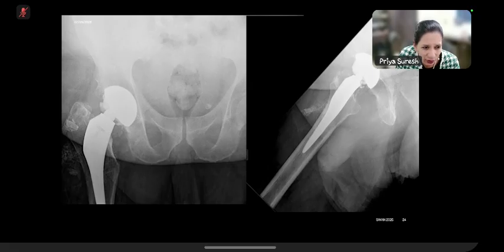And okay, even if you miss that, this is not right. This is not symmetrical. Where is the other part of the head? Why can't you see a nice, rounded thing here rather than so much asymmetry? This is not right. Okay, these things here are not right. It'll be amazing if you are not thinking about it. It's very easy to walk past this.